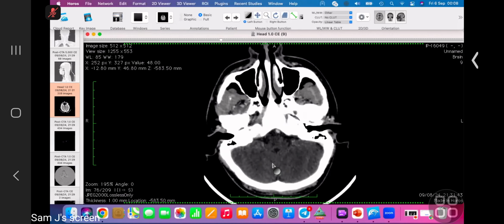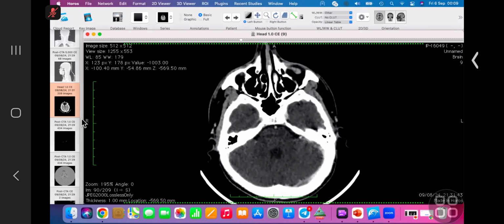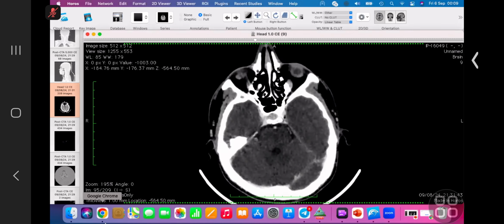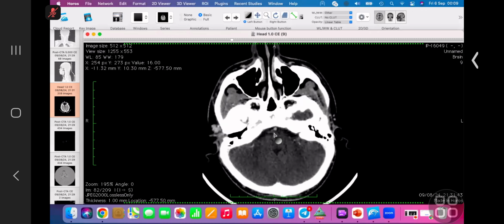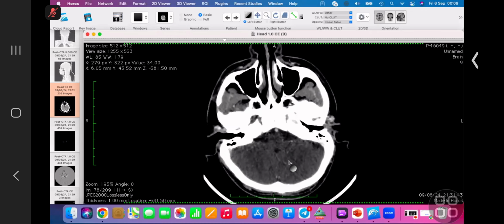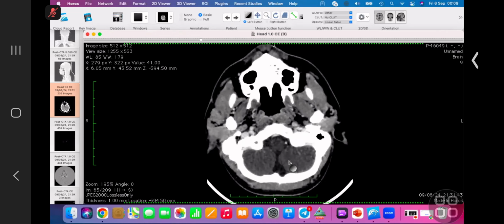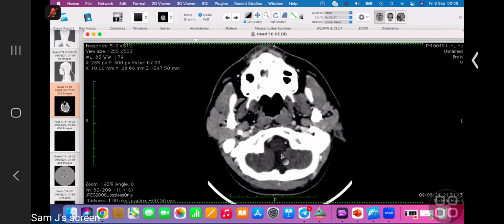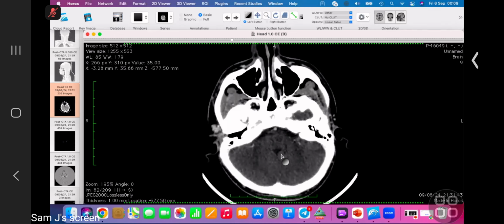Okay, fine. I'll just take over this case. So let me explain. This is the post-contrast cerebral angio that was done for this patient. We can actually start to appreciate the basilar artery, and we can see the bilateral V4 segment of the vertebral artery. Let me just go from the basics on the base here. Yes, so those are the two vertebral arteries we can appreciate. As I keep going up, that's the basilar artery.